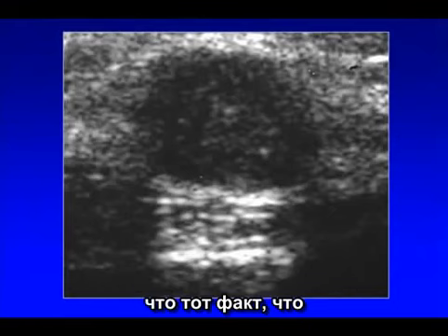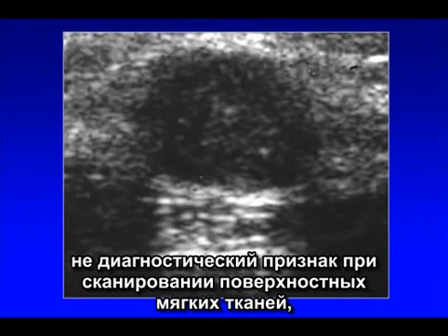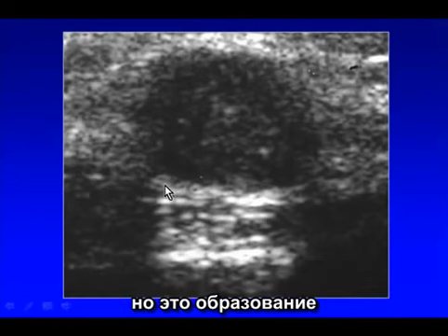This is an example that I show to hit home the fact that acoustic through transmission is not helpful in the superficial soft tissues to tell you if a mass is cystic or solid. This patient had a history of melanoma and presented with a recurrent palpable mass in the subcutaneous tissues. Here is the mass. It has some low-level echoes within it, but it has an incredibly nice burst of through transmission behind it.